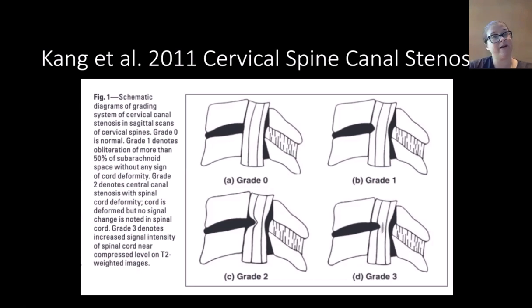You're right. You can have a cervical spine where they're very straight and they have no degenerative change, and the thecal sac, like the CSF, is a bit flattened. In those cases, I might just say they're straightening. There's some effacement of the CSF surrounding the spinal cord, but there's no degenerative change as the cause. There's no cord compression or myelomalacia. And I probably would leave it at that. I wouldn't say necessarily that there is stenosis. I haven't thought about it recently. Yes, you can have developmentally narrow cervical spinal canal as well, but I don't have a measurement per se in terms of determining whether it's present or not.